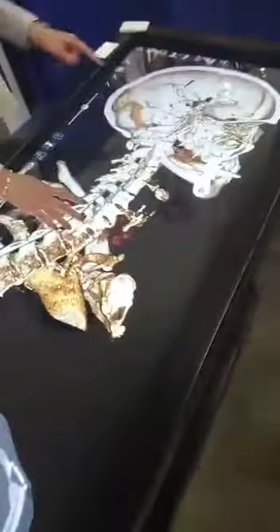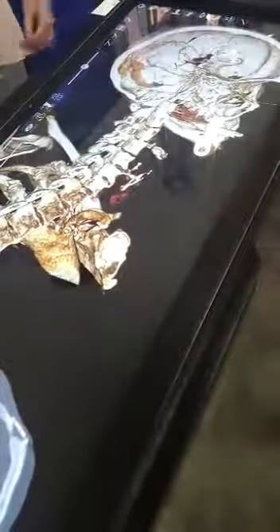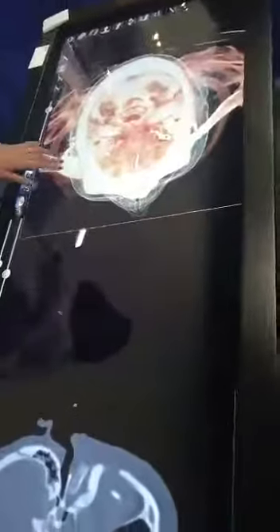You can go ahead and make a quick cut into the 3D model and see where the clips were placed as well. So it's kind of more intuitive when you see something in 3D, where the clips were placed rather than just focusing on a CT. And then you can also add in some vasculature if needed. And you can also move it back down. There's other ways where you can utilize this, where I bring in transparent soft and hard tissue. And so in this case, you still see where the clips were placed.